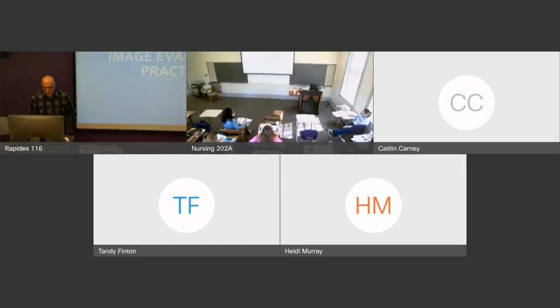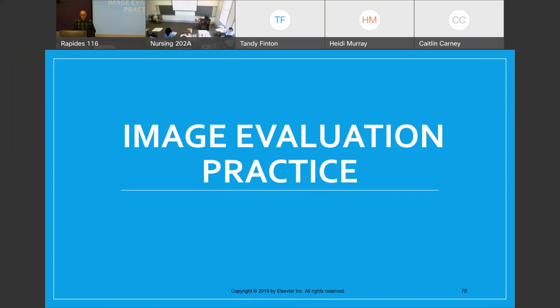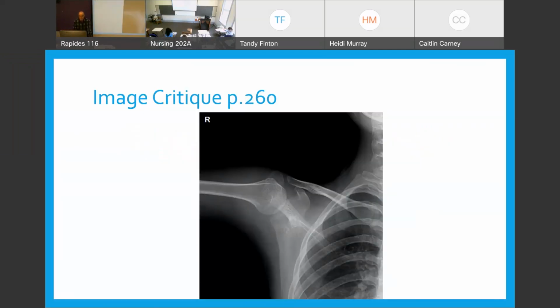All right, image evaluation practice, and I do have another whole presentation for image critique. Now, do I understand we have another meet on this, another lecture Tuesday? Here, all right. Okay, Lillian, what are we looking at?